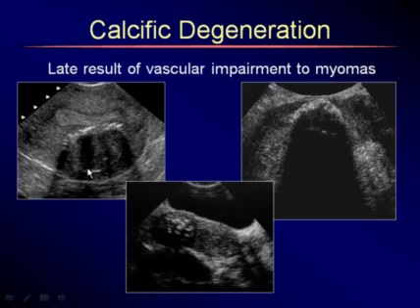The fibroid becomes calcified and slowly involutes. And here are some different patterns. Here's kind of a peripheral calcification with a lot of attenuation. Here's sort of a tip of the iceberg appearance where you only see the top part with dense, strong shadowing, very few reverberations. And here a speckled kind of a pattern, the pattern of the so-called popcorn calcification.